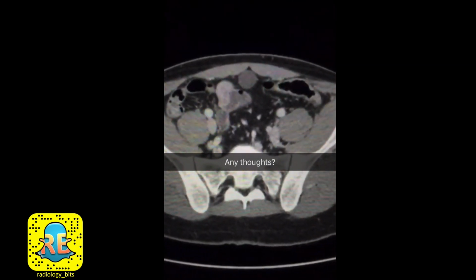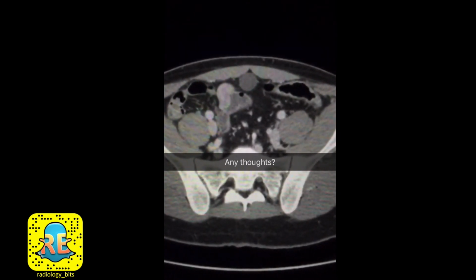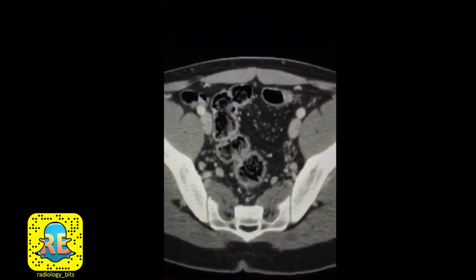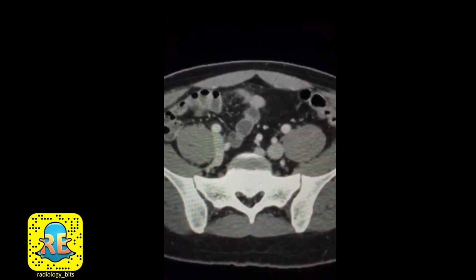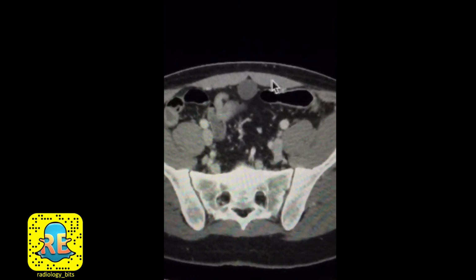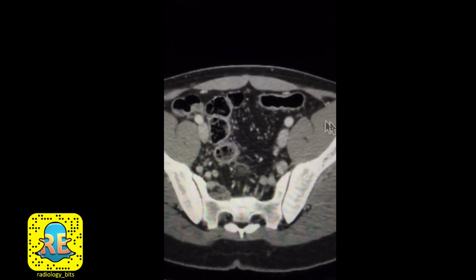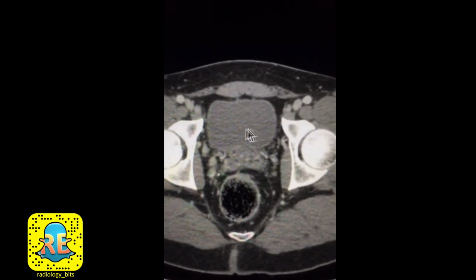Now, after discussing all of these options, none of which represent this case, what is the real diagnosis here? The most important observation is that this simple cystic abnormality has an anterior midline location. It resides immediately behind the anterior abdominal wall. As you see here, it's abutting the rectus muscles. And if you look very carefully, you'll observe that it has this dot-like linear communication all the way down with the urinary bladder.